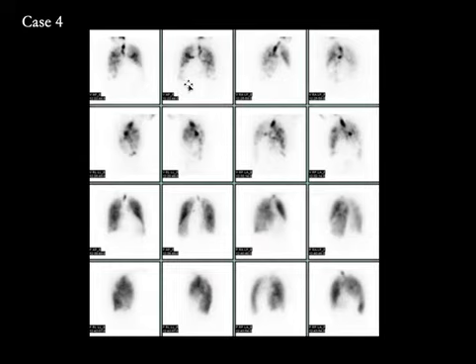So when patients have severe COPD, ventilation is worse compared to perfusion. This is a low probability scan for PE. There is also redistribution of perfusion where there is a loss of gradient from below upwards and posterior to anterior, and most of the perfusion here in the left lung and here in the right lung is in the superior and anterior pulmonary segments.